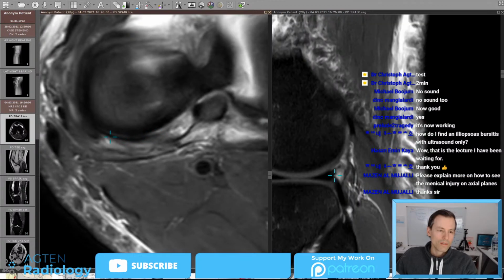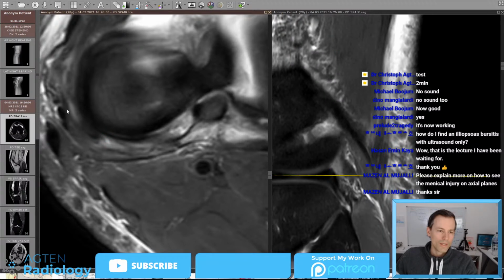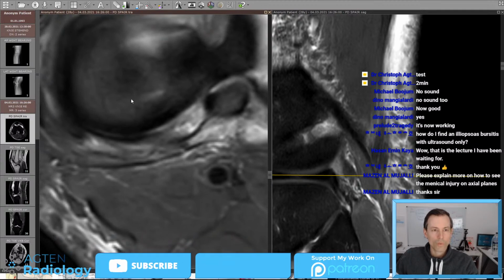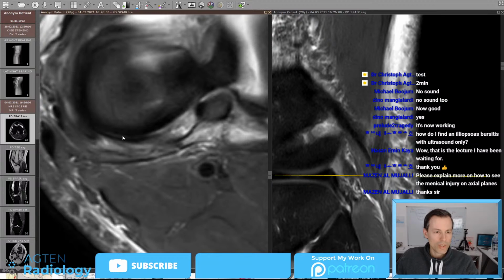And you can see all the way here. And what you now can see on this transverse, and this is also again an indication why the transverse sections are actually quite good, is that we have this bright structure here between the base of the meniscus and the Risberg ligament. And sometimes they are blending in about at this level. Now this is a little bit more laterally than we would like, so potentially it's also starting to rip it off.